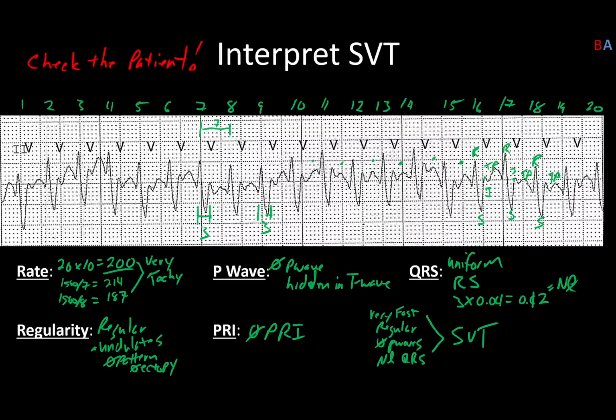Now, for you advanced arrhythmia folks, I'm going to change to blue here so you can tell the difference. This is still kind of where we stand. You know, it's still SVT no matter how you cut it. What I do want to point out is, why is that QRS so wide? Why does it look so funky? And so I'll give you a little bit more information.